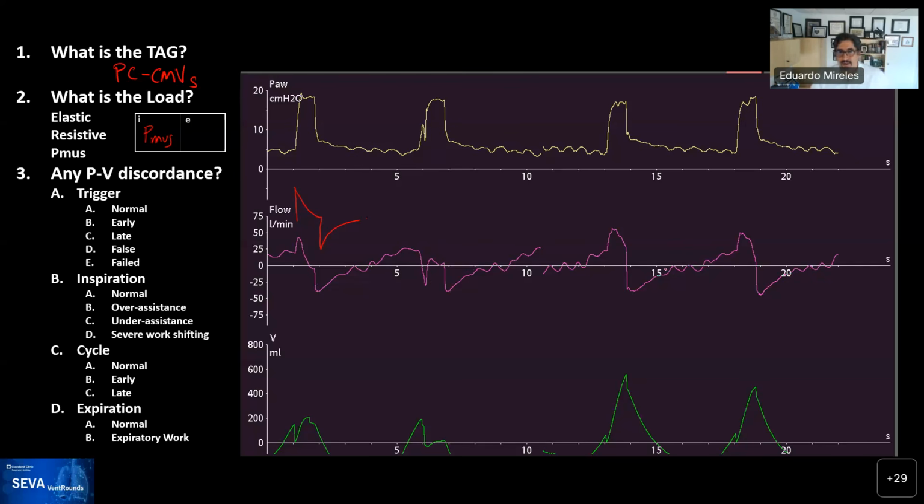Roberto, thoughts? I don't know, on the first breath and second breath, it looks like it's decayed almost to zero within a second. Well, this is the second. Hard to tell, right? Yeah, that's why I cannot really. I mean, I see all these little wiggles here, so I'm not sure. Yeah, and you don't know how big of a volume got exhaled there because some of it got exhaled during the inspiration. Yeah. It's indeterminate, yeah. I would say I'm not gonna bet on this one. I'm just gonna say I cannot tell.